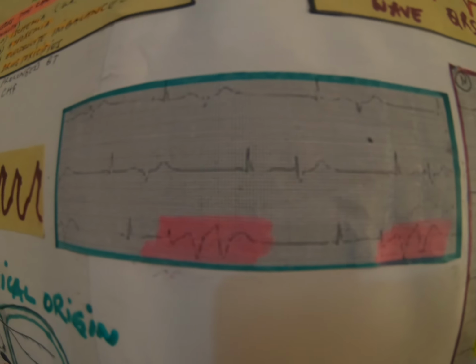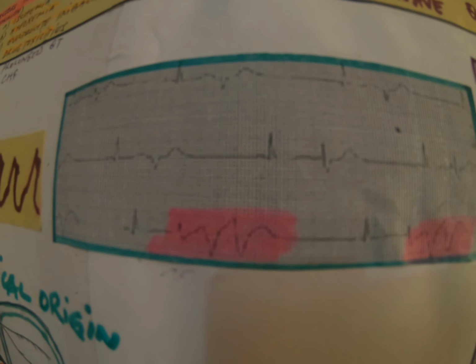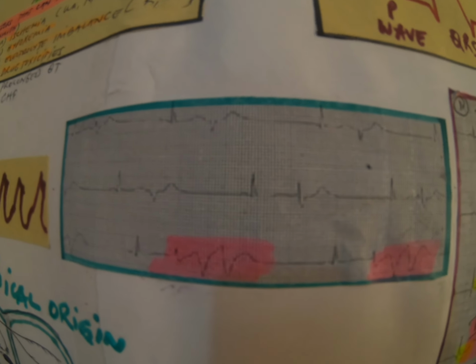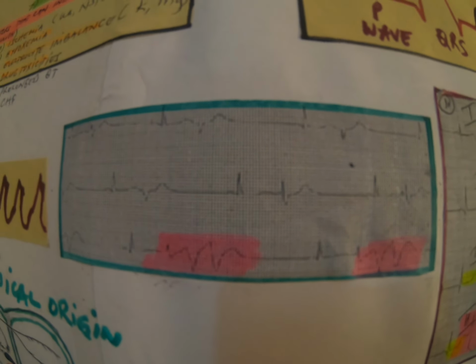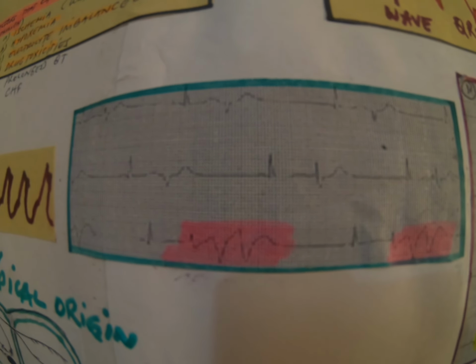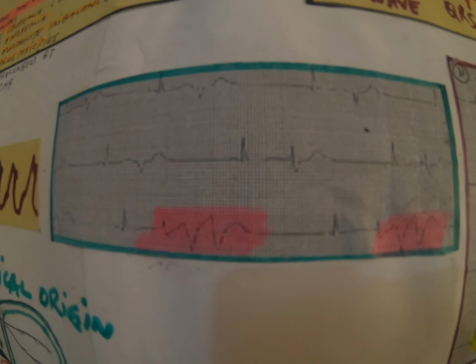Okay, that's one. If they're getting frequent, there's something wrong. Probably your potassium is low. Start checking your blood works. Magnesium, potassium, patient. Okay, and your last ECG. Okay, medication ongoing, amiodarone. Okay, start checking, because if they fall under the T wave, that can create a chain reaction of VTAC.